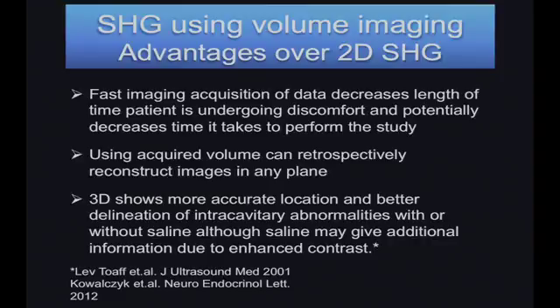So let's just take a look at what the advantages of 3D sonohysterography may be over 2D sonohysterography. First, fast imaging acquisition of data would decrease the length of time the patient is undergoing discomfort and potentially decreases the time it takes to perform the study. And using the acquired volume can retrospectively help us to reconstruct images in any plane.